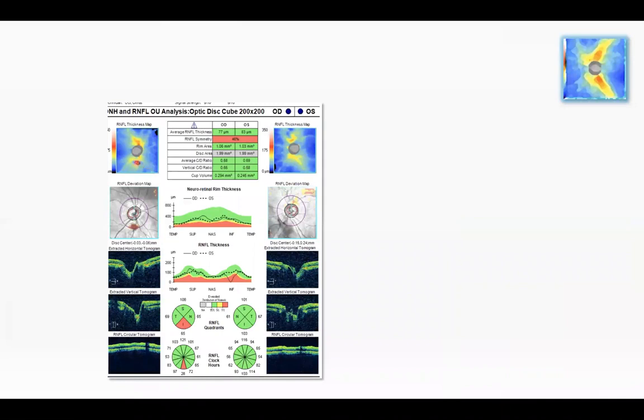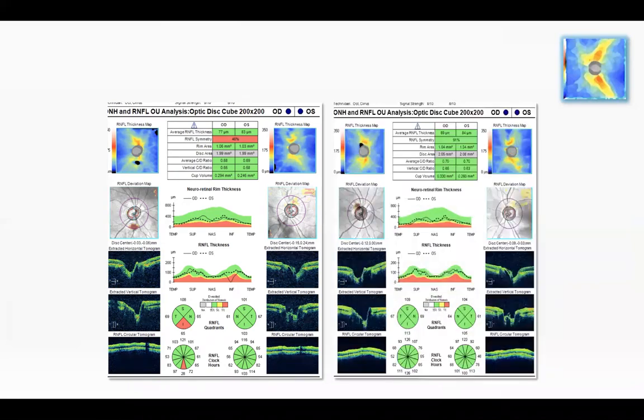Look at this black area. It's an easy one. It means the retina was not scanned there. It is evident on the circular tomogram and also on the TSNIT plot. When you ask the patient to move his eye and rescan him, after a few eye movements, the white ring is out of the way of the calculation circle. Also, the clue here is the zero RNFL thickness in this TSNIT plot. As we said, because of the floor effect, it's never possible.